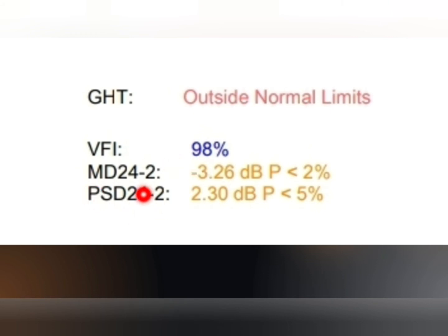Now let's move to pattern standard deviation. Pattern standard deviation tells us the contour of the hill of vision, whether it is smooth or irregular. PSD does not have any sign in front of it, and if there is no significant loss of visual field, it will not have any p value with it. But if there is significant loss of visual field, it will be expressed with a p value. So if we see that pattern standard deviation has a p value, it indicates something abnormal is going on, and it is quite possible that a visual field defect is there, okay.